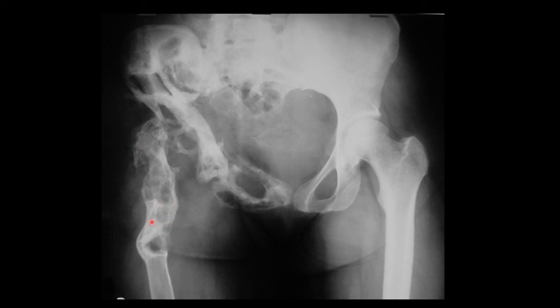You can see the secondary increased density of bone by Wolff's law. When you destroy bone slowly and increase load on the residual bone, you can see the increased density. So this bone has had a long time to compensate. So this disease is a slow, insidious process. Therefore, bacteria like Staph aureus are unlikely to cause this, because that would cause septicemia and death long before the bone would have a chance to do this. This process may be caused by something like TB, although TB tends to cause ankylosis. And this is, in fact, an example of a parasitic infection, echinococcus, also known as hydatid disease.